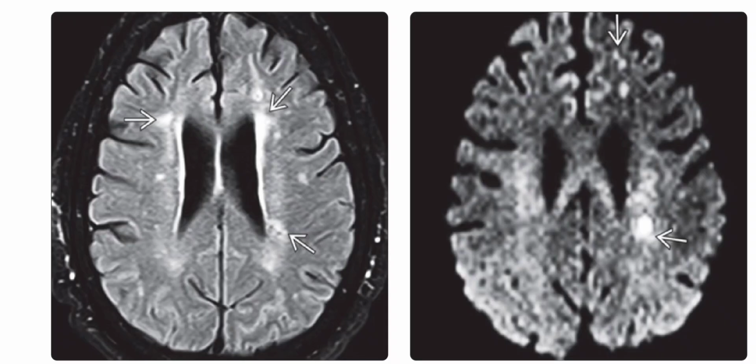So the left image is of a 68-year-old male in the ER with acute stroke symptoms and a negative non-enhanced CT scan, which is not shown here. Now the MRI shows extensive focal and confluent hyperintensities in the corona radiata and deep periventricular white matter of both hemispheres. Right is the axial DWI in the same patient, and it shows several foci of restricted diffusion that line up along the periventricular deep white matter of the left hemisphere.